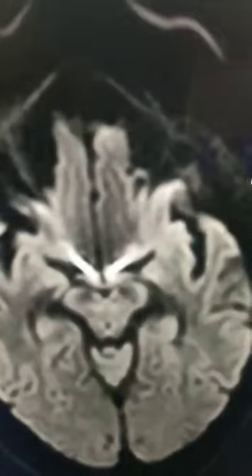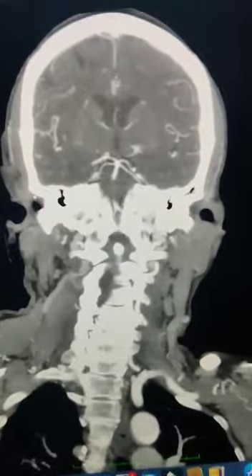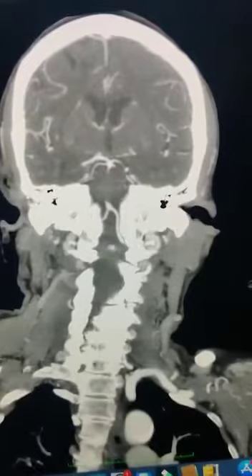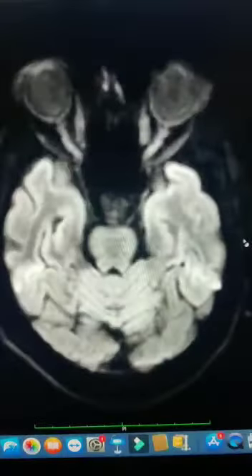This patient, who had left-sided weakness, had complete resolution of symptoms by the time he reached the hospital. The MRI was normal. The CT angio, however, showed a proximal to mid-basilar occlusion. As the distal basilar was filling well through the PCOM and the patient was preserved, it was thought to be secondary to intracranial atherosclerotic disease.